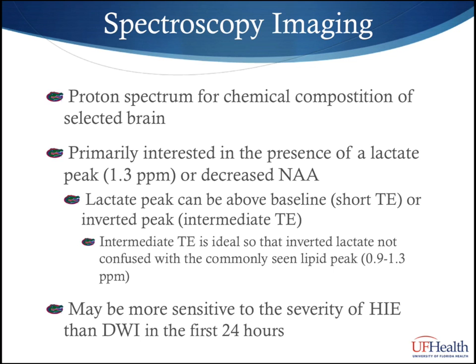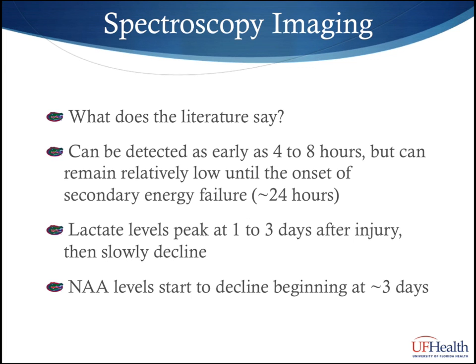This lipid peak does not invert at standard echo times, therefore it's not to be confused with the inverted lactate peak. Spectroscopy may be more sensitive to the severity of HIE than diffusion-weighted imaging and more conventional sequences such as T1 and T2, particularly in the first 24 hours.